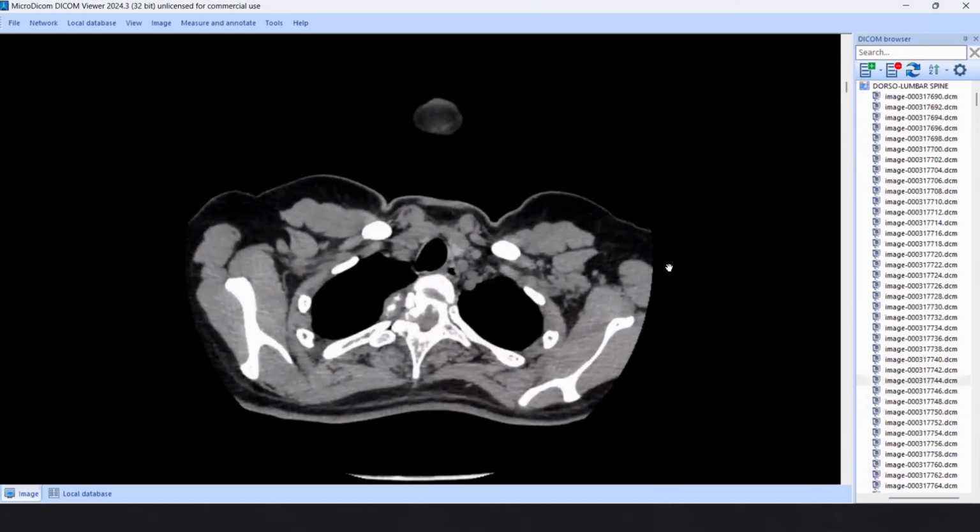Okay. I think also there is a suspicious intraspinal, intra-thoracic, also intraspinal soft tissue component. Yes. So we have it related to the dorsal spinal right neural exit. Okay. And also we have a suspicious intraspinal soft tissue component compressing the spinal cord.